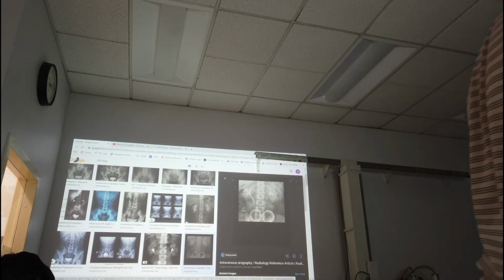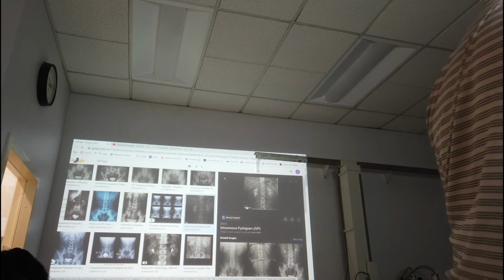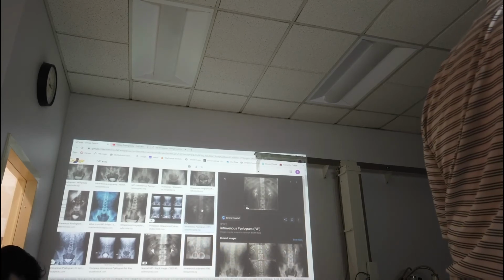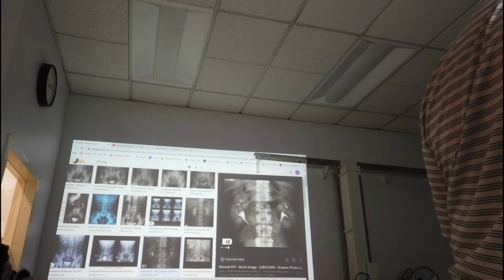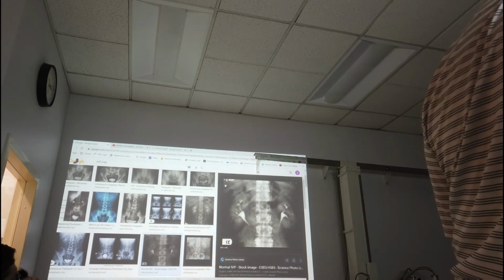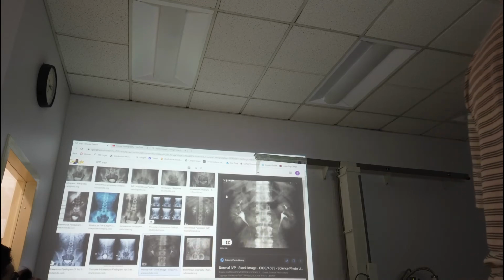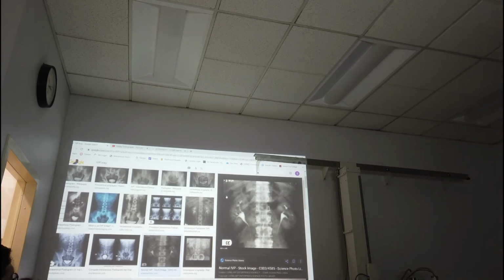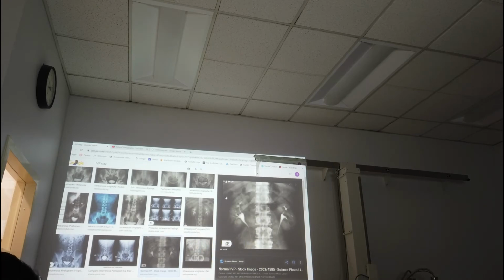But these exams too are all timed exams. You can see here, see how that's 5 minutes? I think it's 5. That's 5 minutes right there. So this is very similar to what we did with the small bowel in the last chapter. This is a functional test. This tells us how the kidneys work, and it also shows us if there's any obvious pathology and stuff like that.